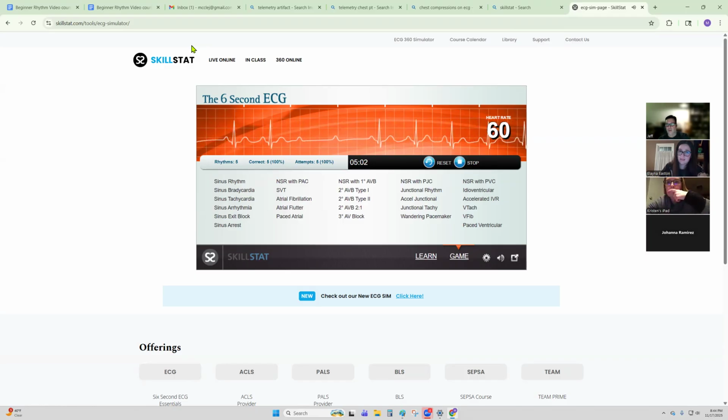Okay. So what happens in the AV node that has missing QRS complexes? It's AV block. You have a missing QRS complex, right? I said AV. But there's a couple different AV blocks. There are. Does your PR interval change at all?